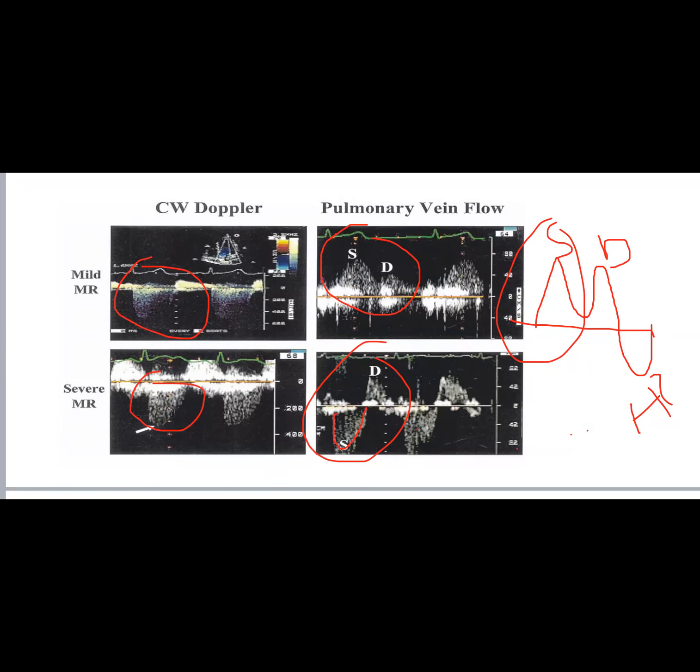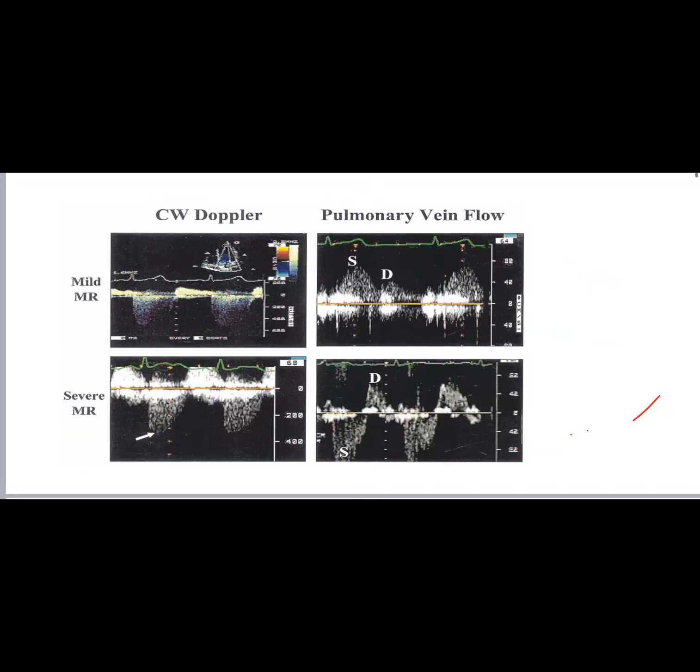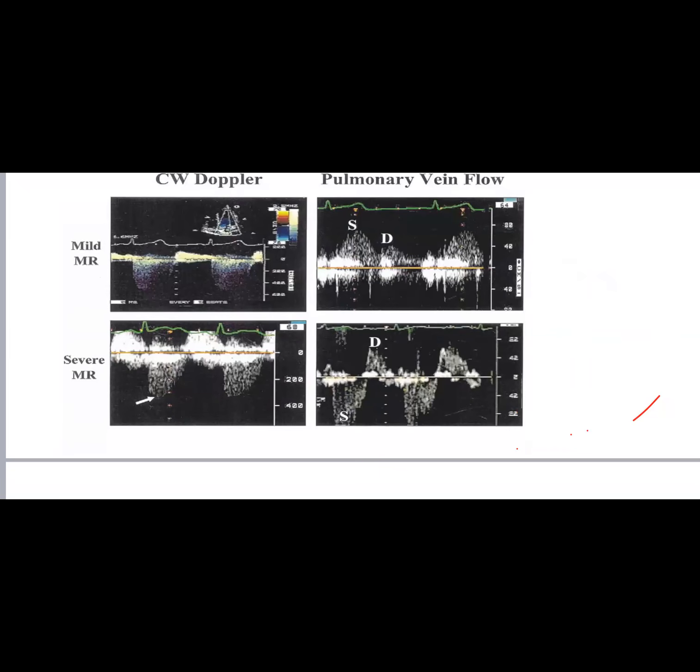Okay? Good. So Dr. Hatim, here the systolic wave in moderate MR may be blunted, isn't it? Yes, exactly. Of course, it's not all or none. It's not just upright and reversal. There are some degrees in between. So when you have moderate, moderately severe, you start to have blunting of the S until it flips down the baseline. Okay, so I agree with you in this.